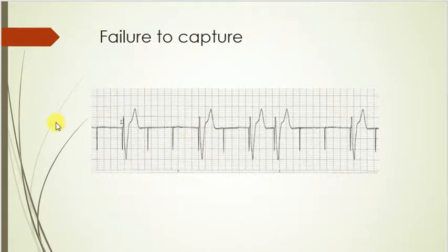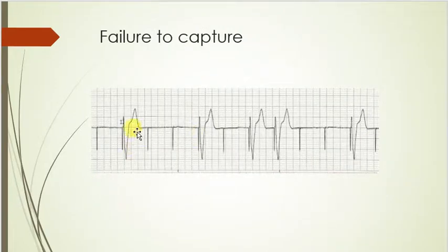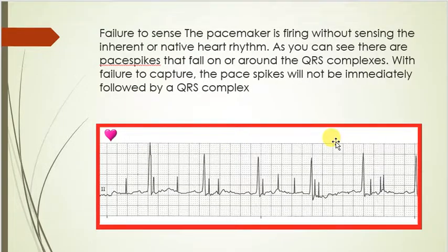All right, and then here's another failure to capture. It looks very similar to that one. So see, it's firing, boom, it gets a nice beat, and then it fires again. So obviously we need to reset the pacemaker.